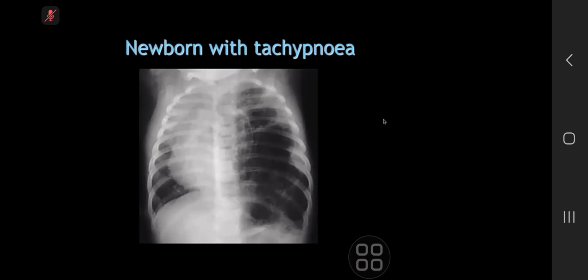Sorry, so this is a frontal chest radiograph of what I'm told is a newborn infant patient. The striking abnormality is in the left hemithorax, where there is increased translucency and absence of the normal lung markings with enlarged cystic spaces. My primary differential is a CPAM on the left, but I would also include in the differential diagnosis a large congenital diaphragmatic hernia. I would recommend that the patient could have an ultrasound scan and cross-sectional imaging for further evaluation.